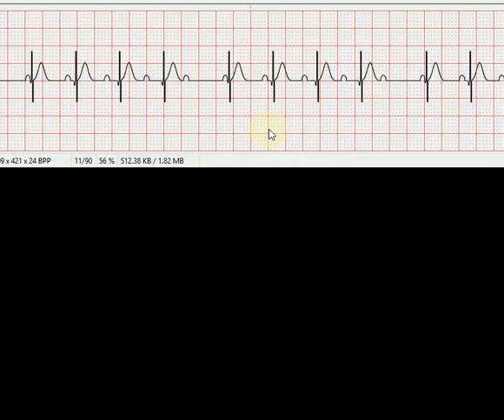Heart rate's 100. So borderline, you could call this sinus rhythm with Wenckebach, or you could call it sinus tach with Wenckebach. If it's actually a rate of 100, I don't care. If you get real picky and you go in deeper than that and you determine the heart rate's 101, it's sinus tach, and if it's 99, then it's sinus rhythm. But if you get 10 beats on here, I give you the opportunity to flip a coin. You can call it either sinus rhythm or sinus tachycardia.